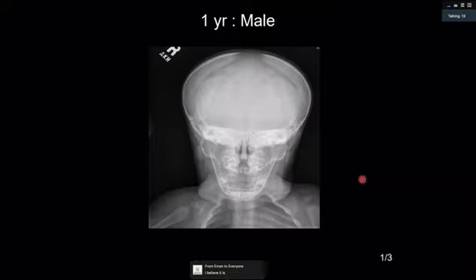So my differential diagnosis could be cleidocranial dysostosis. I'm searching for any Wormian bones, but I cannot see this clearly. There is a differential diagnosis for hypoplastic or dysplastic clavicles. I really do not remember, I only remember the cleidocranial dysostosis.